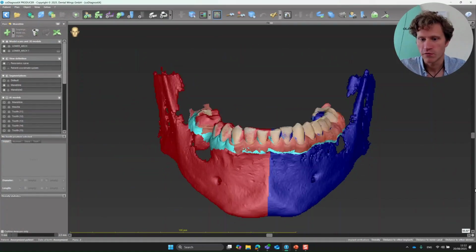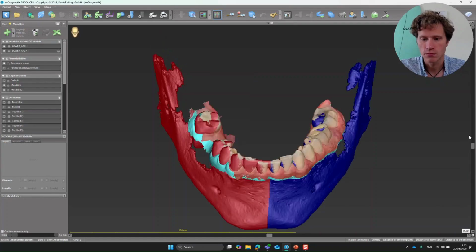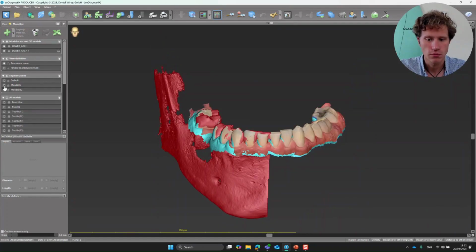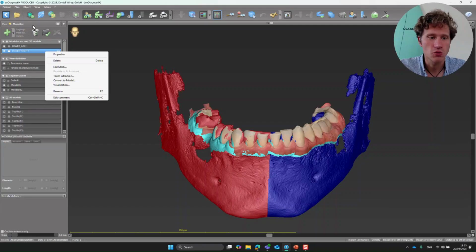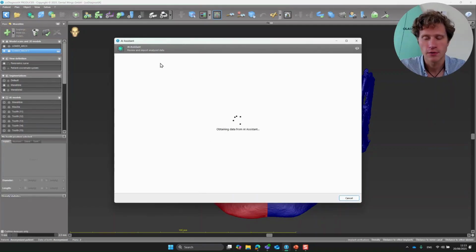Now what do we have? We have two different segmentations. The whole segment and just a part. And let's try to align with just a part and measure what difference we have. So I start with AI assistance also. I'll go here.